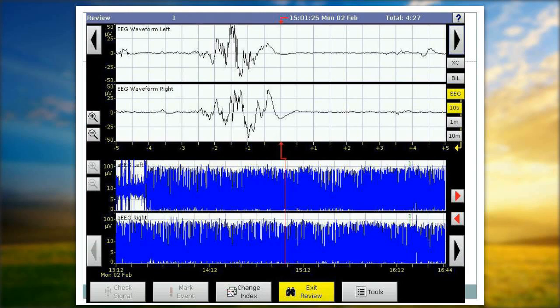Well, the next abnormal pattern for a term baby, and even really for a preterm baby, is the pattern we're showing here. The thing I want you to draw your attention to is that our upper margin is still above 10, but our lower margin in this particular case is very low and flat. There's only just occasionally where we see that the bottom margin is elevated by even a couple microvolts. So this is what I want you to look for, that variability or lack of variability.